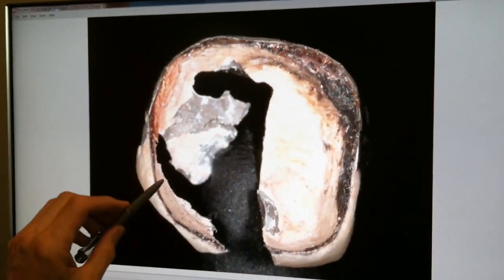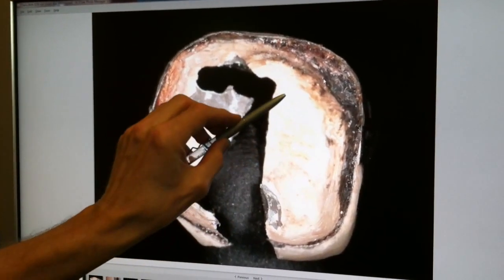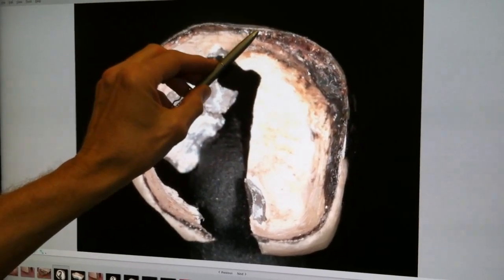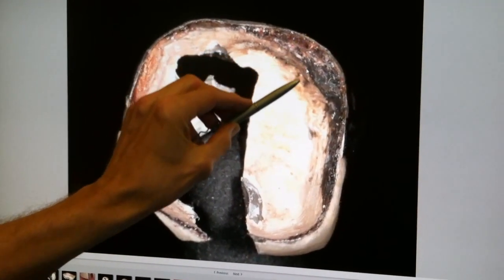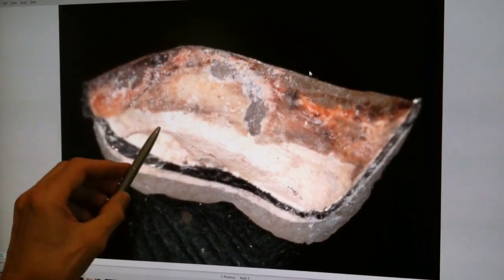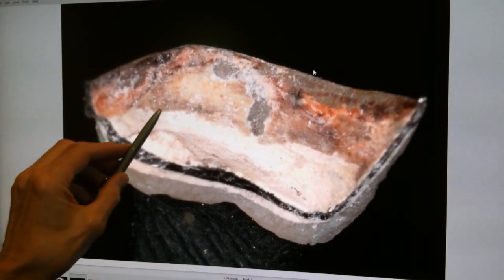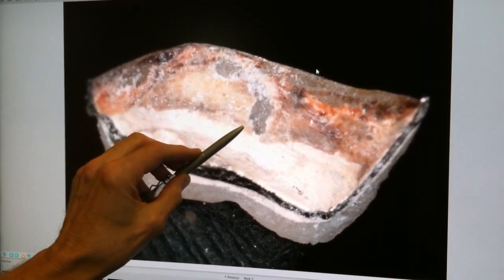Now if we take a look at the inside of the crown itself, you can see that again the cement was nice and white, pristine, just like when it was new up here, but around all the edges on this crown you can see where the cement was leaking. There was marginal leakage here and deterioration of the cement, allowing bacteria to get up underneath the crown and cause that recurrent decay. In a little different view again, taken from the side, you can see again this process of where the cement has actually disintegrated, and this is the pristine cement line, and you can see where this leakage has actually come up underneath to this point right here.